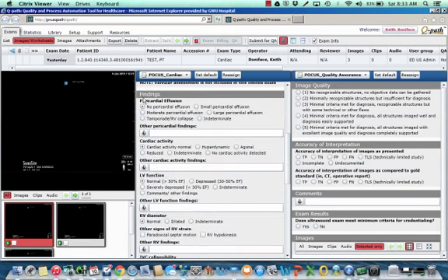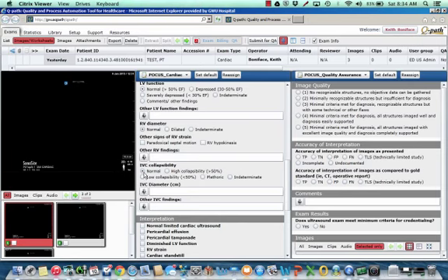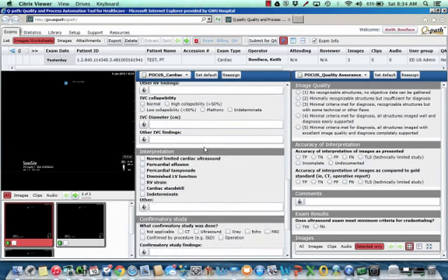As you get down here, you'll see findings. There's a lot of stuff here. If you didn't evaluate something, don't click it. If you didn't really look at IVC collapsibility, what you can do is right-click any of these things that you didn't do, or didn't evaluate. You can right-click and it'll go away, or you can left-click and it will populate that little box.